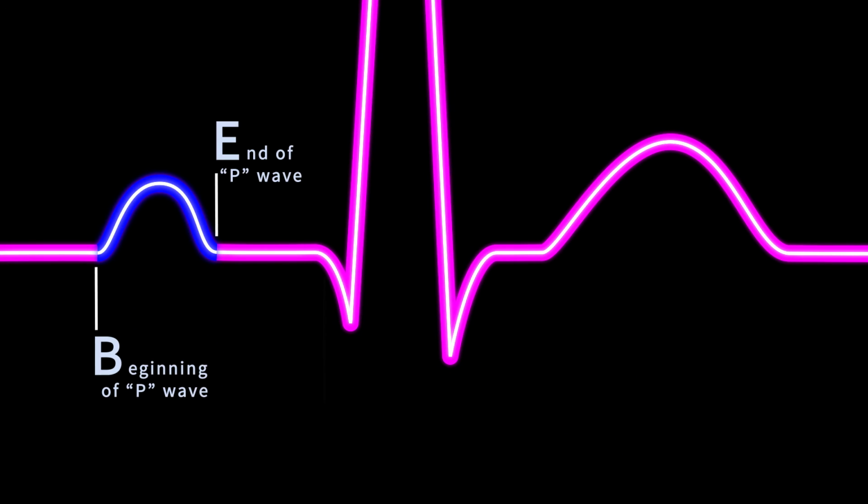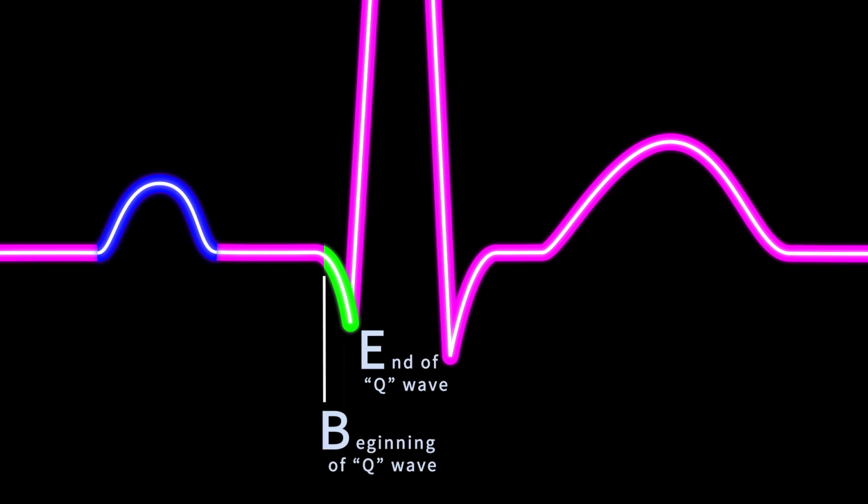Remember, the PR interval starts at the beginning of the P wave and ends at the beginning of the QRS complex.